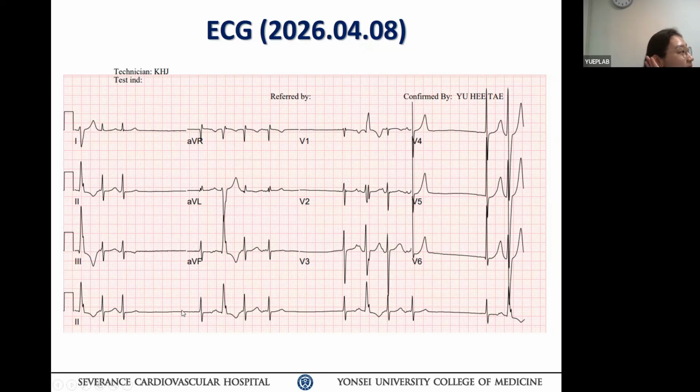This is not AFib, so it couldn't be permanent AFib. I just thought that the P wave looks very large, so that's why I guessed like that. Sinus node dysfunction is common in AFib patients. Except that, I agree with all the prior opinions.